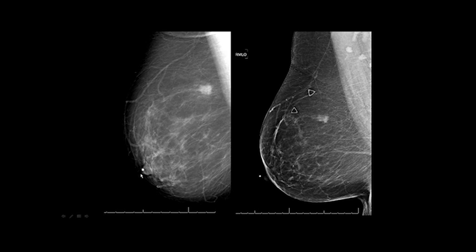So you can see here the nipple's not in profile. There's no IMF. There's a large fold up here in the breast created by the tech. And also there's hardly any muscle on here. Compared to the positioning over here, same patient, about a week apart, different technologist. You can see the difference.